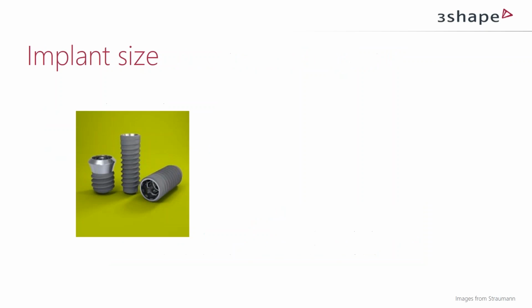So let's start with the length and sizes. Implants come in many variations. They come short, long, fat, slim, groovy, machined, and so on. And most of you out there already know this. But why do we choose the ones that we are using today, and why did we change from the ones that we used 2 weeks ago?